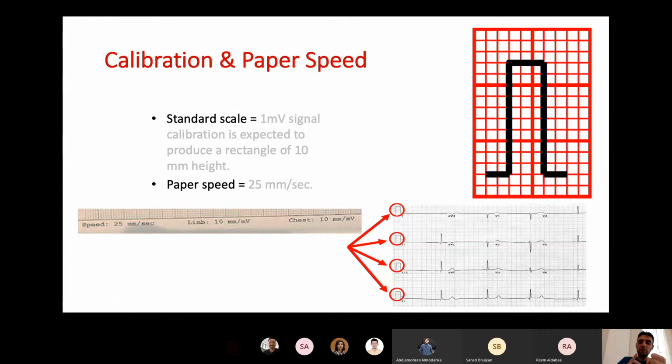First of all, you need to know the name on the ECG, and make sure this is the ECG that you're interested in for that specific patient. You want to examine patient Ahmed, and this ECG is for patient Ahmed, not for someone else. So name is important. And then age, because depending on the age, normal values differ.